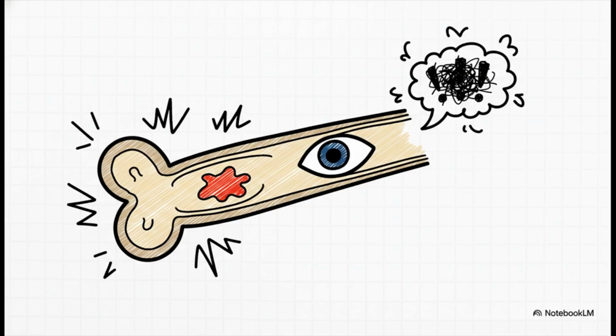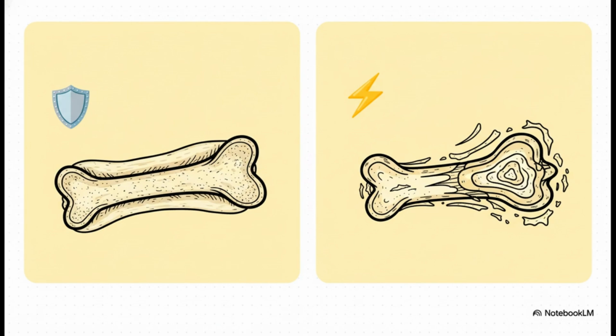It's like an eyewitness account from the bone itself, telling us exactly how it's responding to this intruder. And the bone's testimony can go one of two ways. A benign reaction, which comes from slow irritation, is thick and solid. The bone basically had time to build a strong defense.